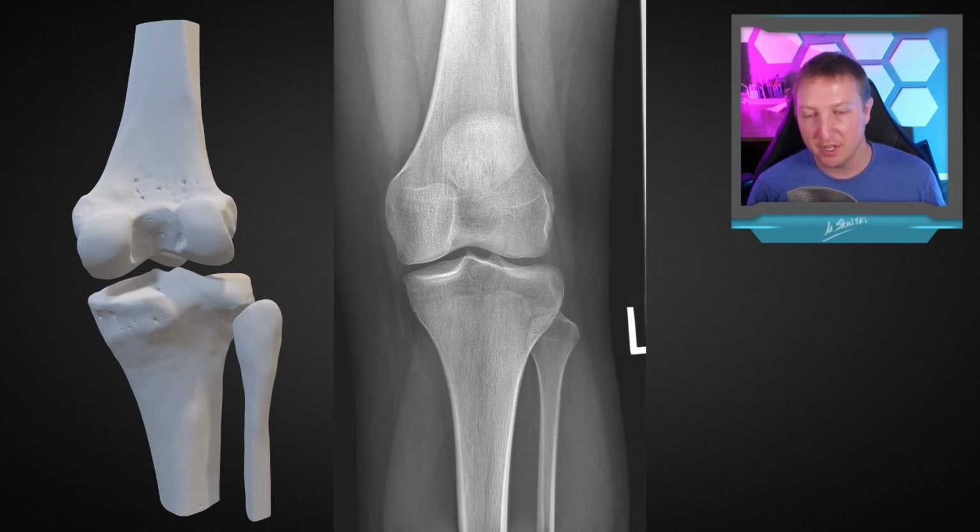All right. And one thing I actually forgot to point out with the condyles is when we're looking at the condylar articular surface, we want to make sure that it's nice and smooth and flat to convex across the surface here. But you'll notice on the lateral side here, we almost have two different contour lines because we're seeing the junction between the trochlear articular surface and then the condylar articular surface. And so between those two is called the condylopatellar sulcus. And we do see that on the lateral side sometimes more prominently.